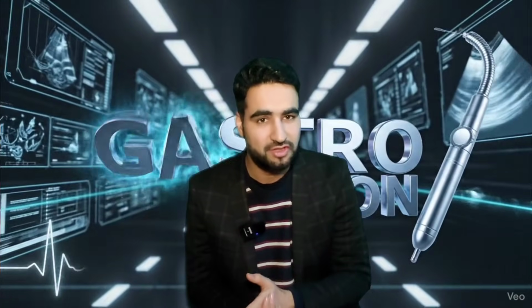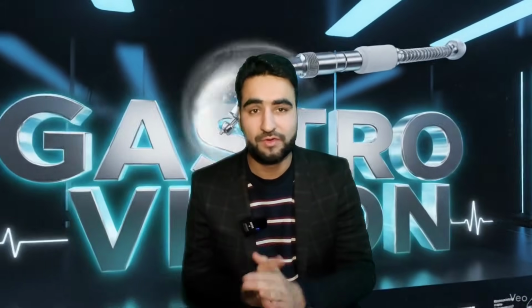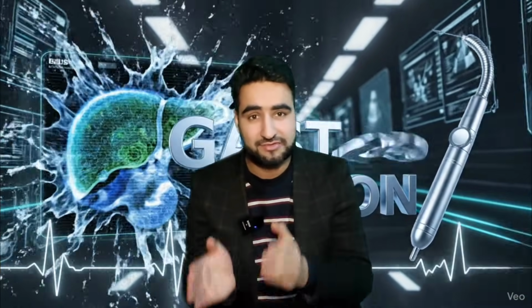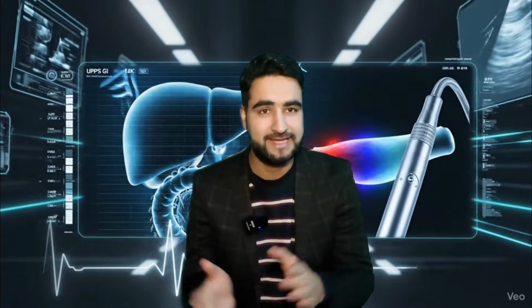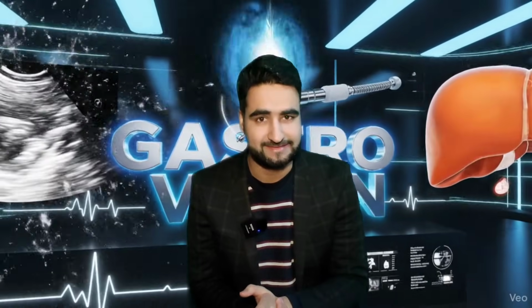My advice is to watch this video multiple times. Repetition is the key to consolidating these concepts in your memory and building that muscle memory we all need in endoscopy. But before we dive in, here is one golden rule you must remember. All the movements you perform are transmitted accurately to the transducer only when your scope is straight, never twisted. Keep this in mind throughout your practice.